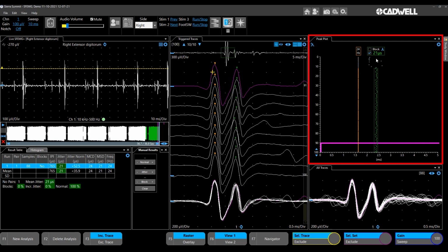I'm just going to eliminate that top section, and if you want to, you can eliminate anything on the other end as well, just by clicking and dragging up and down. You can also manually adjust the left and right side of the box if you want to include or exclude any outliers that are found.